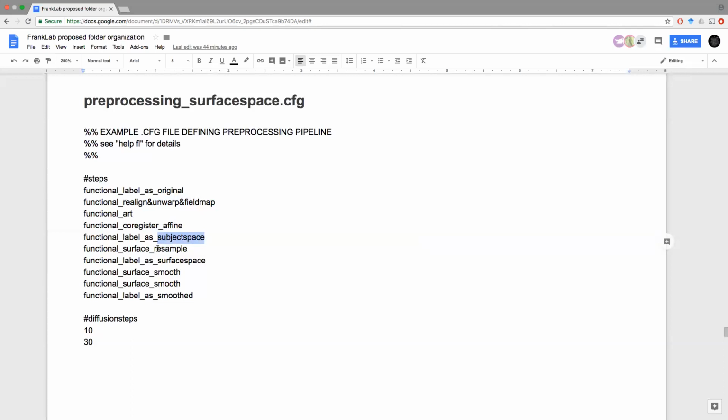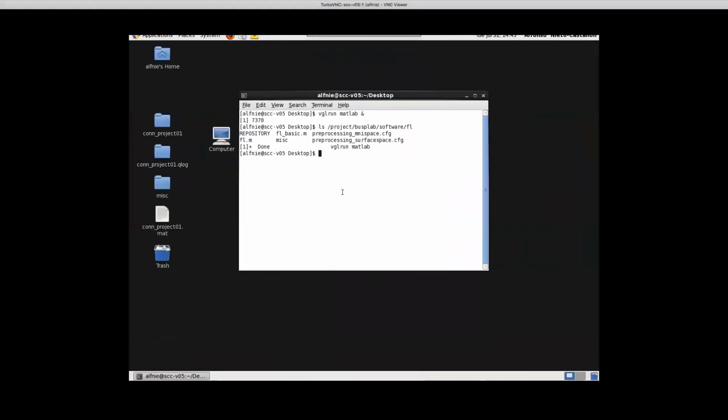Why is that surface in FS average space and not the individual subject's? Right, so you are asking why don't we get the data in the actual surface of the subject before interpolating that into FS average? That's what you mean? Yes. So when I say in FS average space, well, your actual data is extracted at the individual subject location of every vertex, right? And let me see if I can specify that with an example. So let me see if I have an example surface data here.